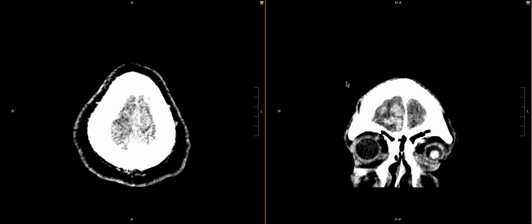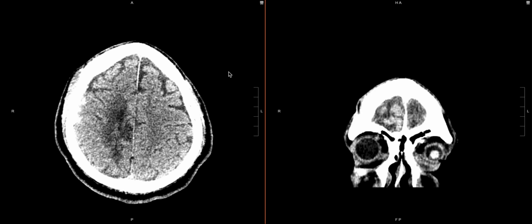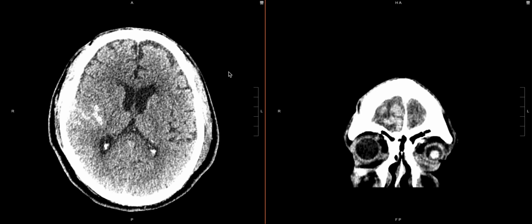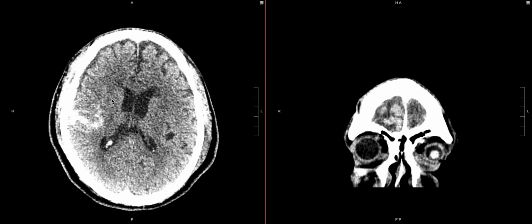In this video, we're going to go over another case in the case series of acute subdural hemorrhage. And this is a tricky case mainly because there's a lot going on in terms of other intracranial hemorrhage. We're on kind of a more traditional parenchymal window.